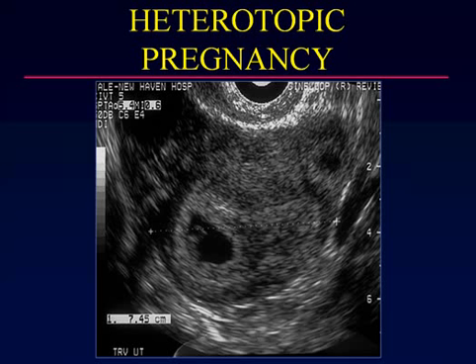So this is a patient who'd undergone assisted reproductive techniques, gotten pregnant, and you can see here there's a little intrauterine gestational sac. You can see the embryo and the yolk sac. It's eccentric. You could even describe this as a cornual pregnancy. But if you look carefully, in fact, there is a second gestational sac here in the left interstitial region.